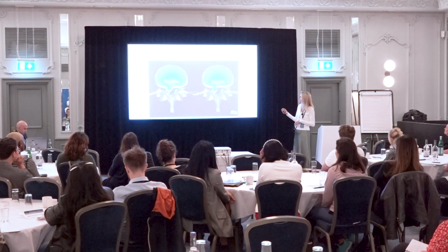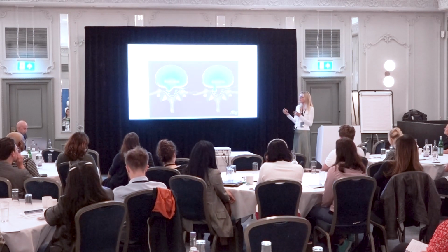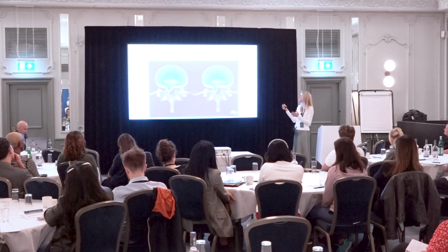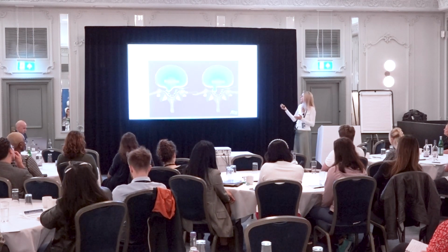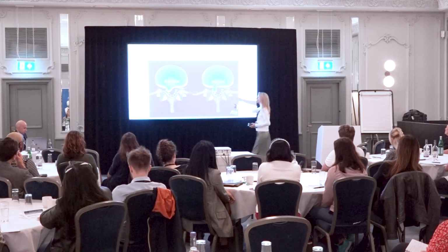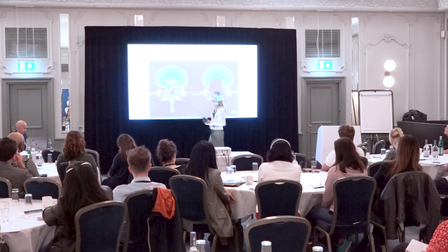I'm going to use the terms that the North American Society uses, just for homogeneity. A protrusion is when you get disc going through a ruptured annulus, has a broad base, and it comes into the spinal canal and compresses. So you see this broad base over here, and it comes down and compresses a nerve.